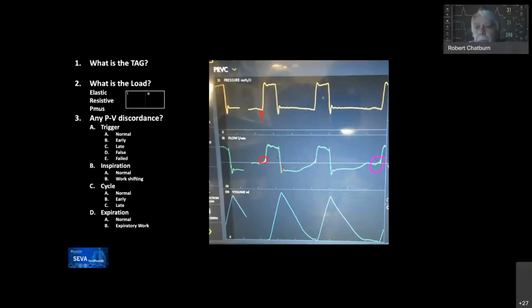Yeah, so I think overall I got the important stuff handled pretty well. I just want to walk through everything again. Since we're talking about expiratory waveforms, if this person is doing expiratory work, you can see it because the waveform bows down like this.